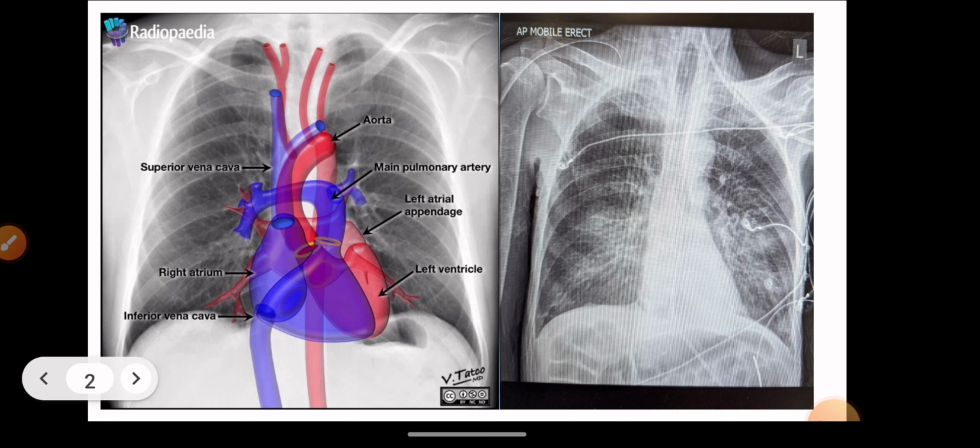Now, a vascular opacity is too much water in the blood vessels, and those blood vessels are the pulmonary arteries and pulmonary veins, and it's often associated with fluid overload and pulmonary edema, and those things tend to be symmetrical because inherently the back pressure is from the left ventricle, and so that back pressure will be symmetrically into both sides. So looking at this guy, without going through it in full details, if we're counting ribs, he's got, I think, 11 even, so he's not underinflated.